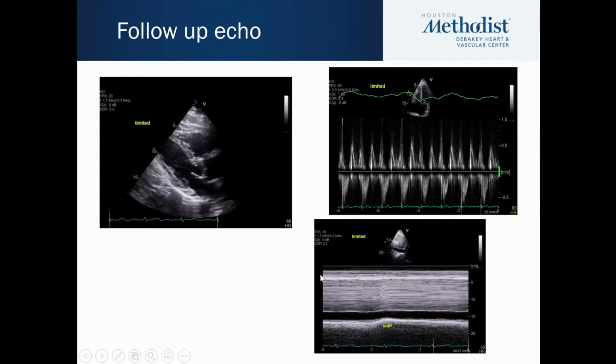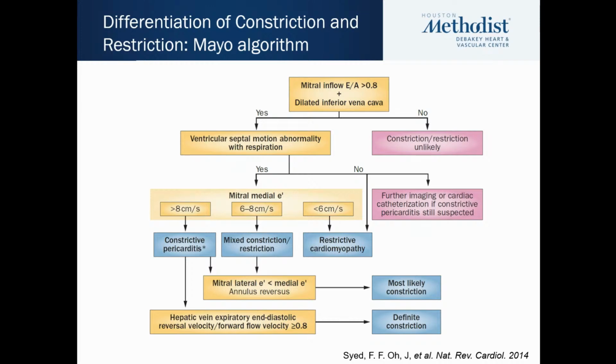And this patient didn't manifest constriction clinically, and this is one of those scenarios that is often termed transient constriction. The vast majority of these will resolve on their own, but the key thing is to watch them with echo as well as clinically to make sure they don't develop the syndrome of full-blown constriction.